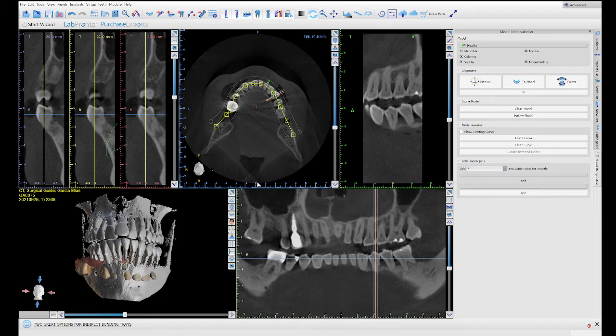So the idea is that you're going to make points, and to make points you have to hold the shift key down, and you have to make points on repeatable or the same locations as you have on the model and the CT scan. You can let go of the shift key to rotate and do whatever you want to do, expand or translate the model.